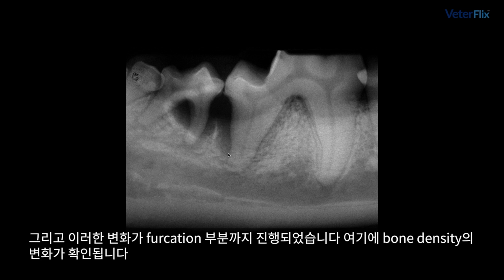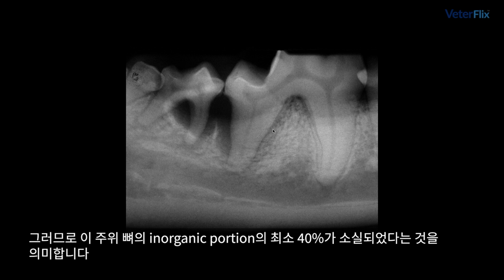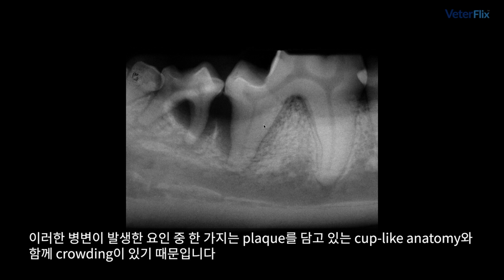We can also see that we've gotten progression to the furcation, and we've got that alteration in density of the bone here. So we've lost at least 40% of the inorganic portion of the bone adjacent to this area as well.